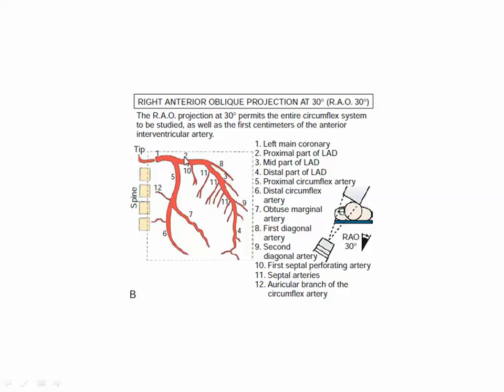What is the left main and LAD? Okay, LAD. Which part of the LAD is the proximal LAD?